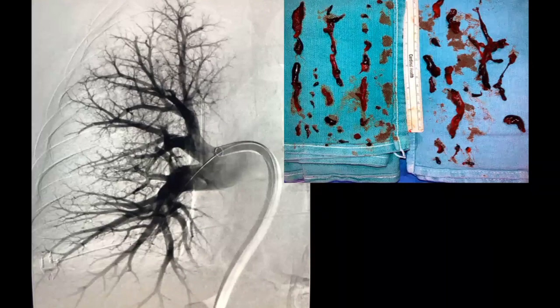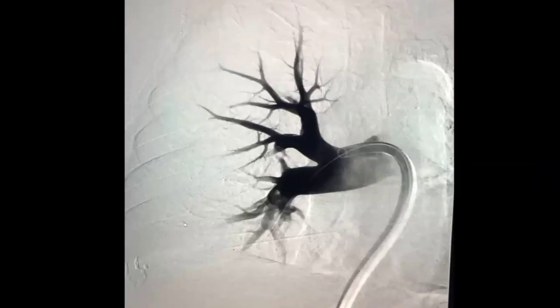I wouldn't have expected you to know that, but remember the pulmonary arterial anatomy. Now, if you think about it, when you say pulmonary venogram, how difficult would it be to get to the pulmonary vein? Imagine where the pulmonary veins are coming from and where they're going into. So this is a pulmonary arterial angiogram, and there are a number of reasons why these are done. You gave a reasonable answer. Obviously, a filling defect, you picked that up very well, that this is a PE.